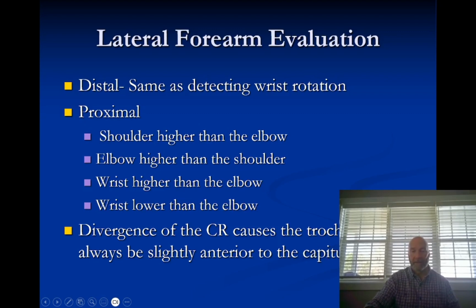So how we're going to differentiate between which condyle is which is we're going to look at the condyle and then look at the anatomy that appears to be articulating with it. The thing that is closest to the capitulum should be your radial head. So you should be able to differentiate between the two. The trochlea articulates with the ulna. If you can just remember radiator cap, you can remember radius capitulum, and then the other two go together.